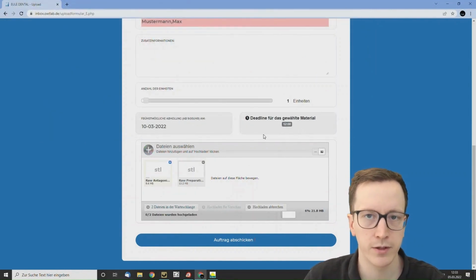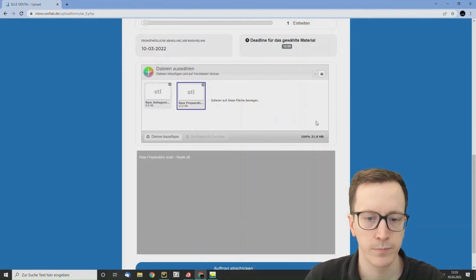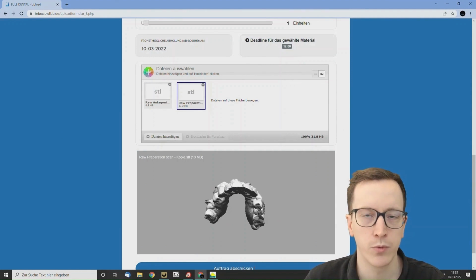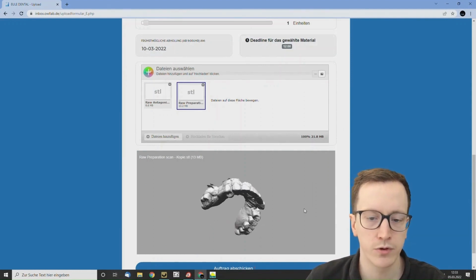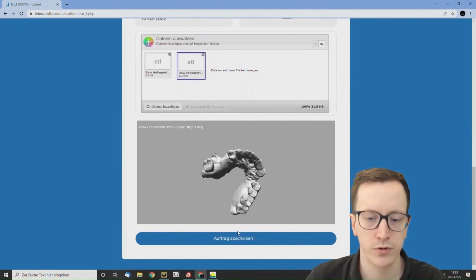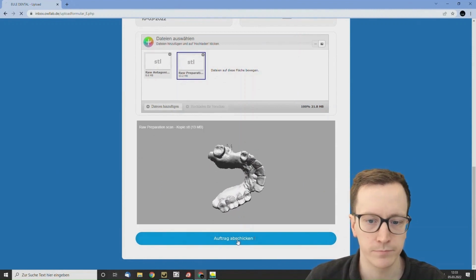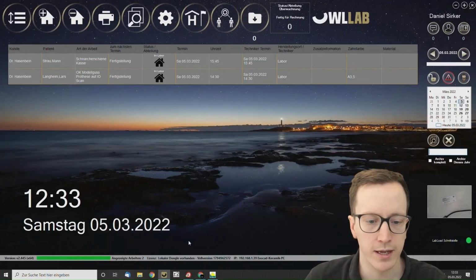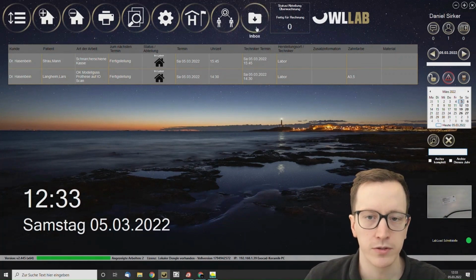At that point, the complete thing will be uploaded and made available for viewing. As soon as the order is uploaded, the customer can view the uploaded files on the website and then proceed with submitting the order. The client will now get a confirmation email, and at this point, we will proceed with all of this in the Owllab software that we have been discussing.